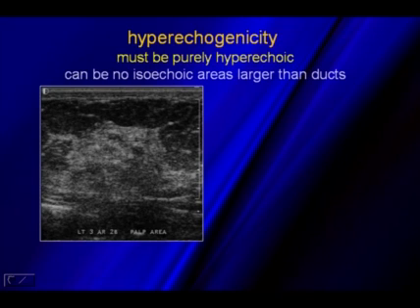If a patient presents with a palpable abnormality, and this person came in feeling that abnormality, we could see that it was just this ridge of normal fibroglandular tissue. Now, anytime we're going to tell a patient that something is normal tissue, what we recommend is that they check that area once a month. We told her to go back and have her clinician recheck this area in 6 months if anything was to change, to have it reevaluated.